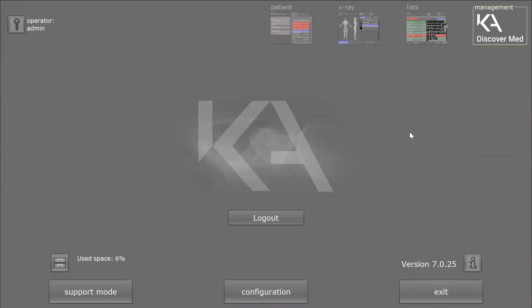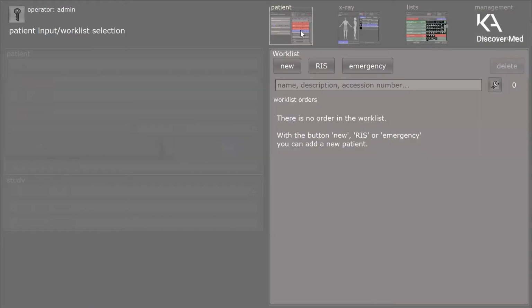The main portion of the program, of course, is at the top here. So we'll begin by entering this screen here. Now, most hospitals, the vast majority of hospitals and clinics will have a work list. It's a simple matter of hitting this button. Here, of course, I don't have my computer at a hospital, so I'm not connected to a work list, but it's as simple as clicking that. All of your cases will load on the left, and you just pick the appropriate one. In our case, we're just going to enter emergency here.